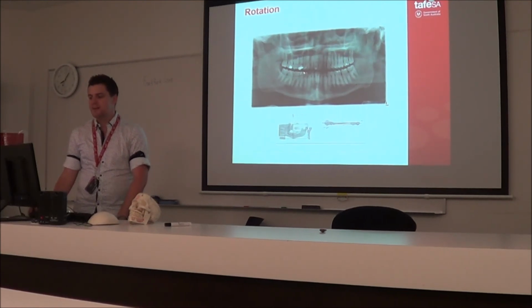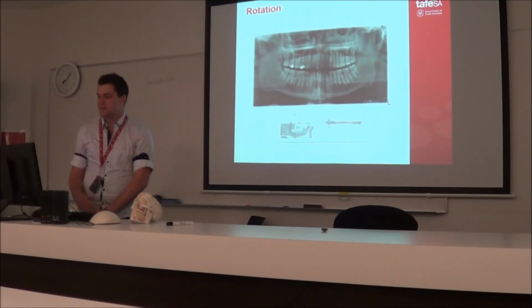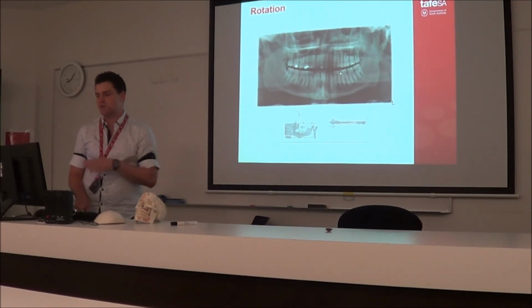Okay, not too bad. So again, this one will probably be a slight turn. Okay, whereas if you saw a bite stick sticking on one incisor and not on the other, that might be a sign that they're not quite centered in the unit.